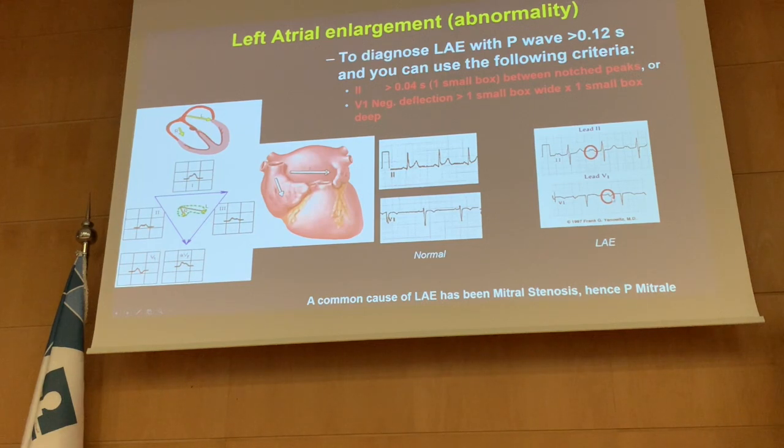And also in V1, there is one above and one below. So this is typical for left atrial dilatation. Remember, atrial dilatation can be seen in all leads, but for positional interest, it will be in lead II and in V1. So we are good now with left atrial dilatation. You're going to read the scenario, then you're going to answer the question.